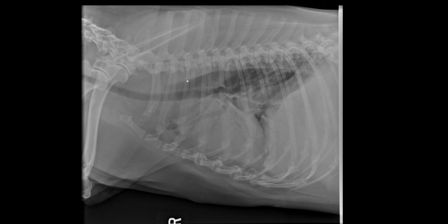So for the conclusions, to go back to the megaesophagus, we cannot be sure if this is a real one or if this is due to sedation, as sometimes the sedative drugs can induce some hypomotility of the esophagus and create this megaesophagus aspect. So this will need to be correlated with the clinical examination, the clinical signs, and if in doubt, you can repeat the radiographs, at least one lateral radiograph without sedation. But it could be real.